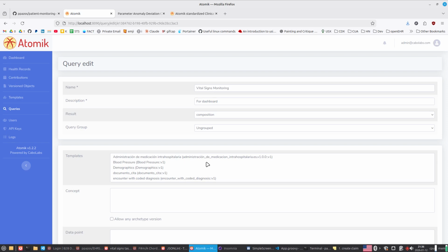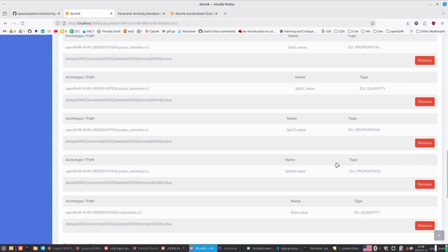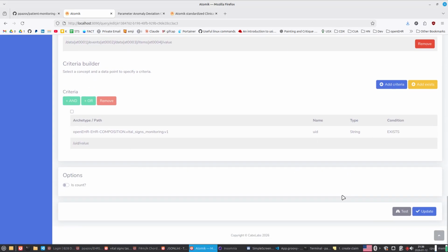You don't need to debug your queries. You don't need to compile and deploy the whole application. You just come here and click on things, select things, or define conditions, and conditions can be really complex. You can do simple conditions, you can AND or OR those conditions to make them more complex.